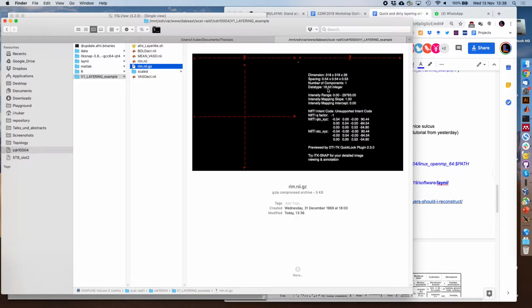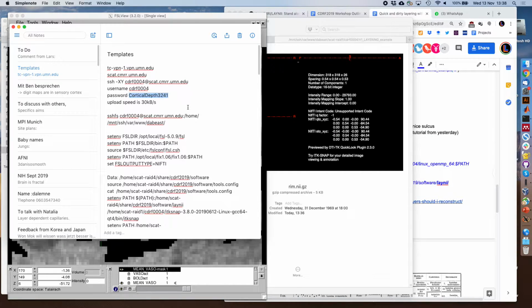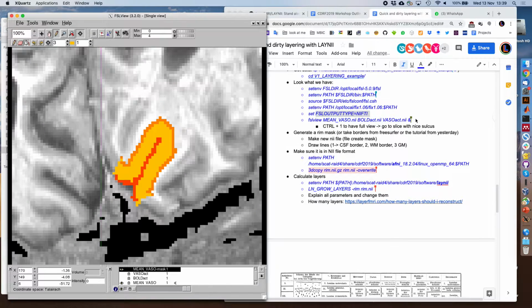However, depending on the range you have, especially with 16-bit, it does not always end up with 1, 2, 3, but with 0.9999999, and then the following algorithms might fail because they are looking for ones and not for 0.9999999s. That's annoying. With FSLeyes, by the way, you don't have this problem anymore. And I'm not sure why, on the server, it doesn't save it as nifty, even though we tell it to. Maybe there's something in the FSL setup here.